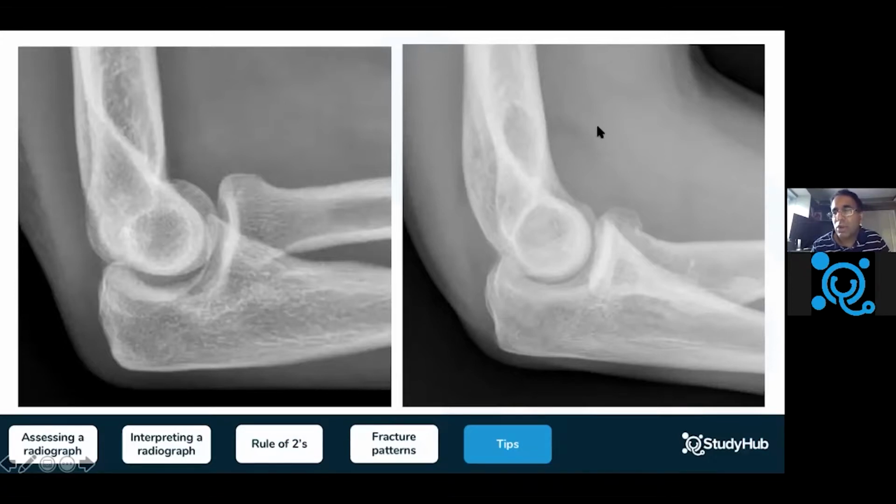This is a joint effusion, and in the event of a trauma that automatically has to signal to you that there is something wrong. There is a fracture somewhere. It may not be apparent to you, but there is a possible fracture. Now, if you then look at the radius over here, that's a relatively smooth transition, and similarly along here, it's a smooth transition. Yes, there is an overlap of bone, but you can appreciate it over here.